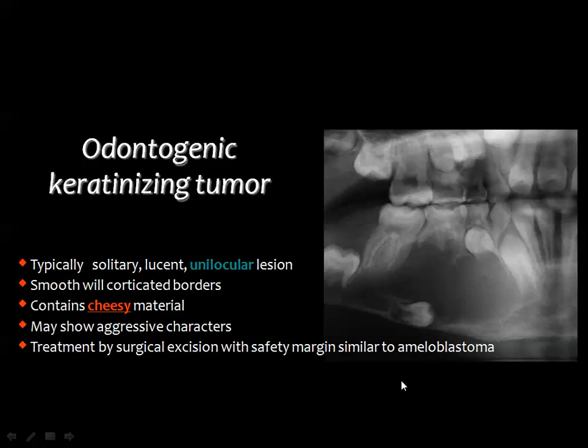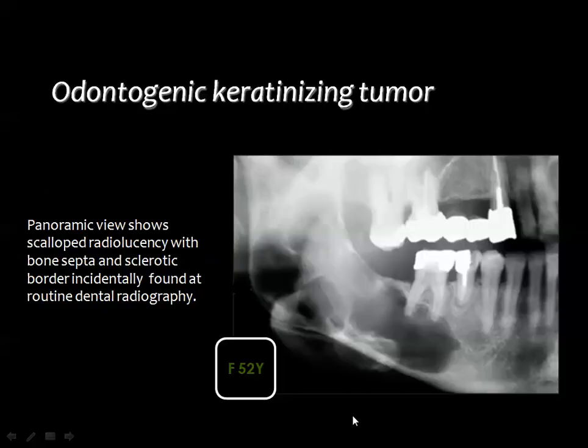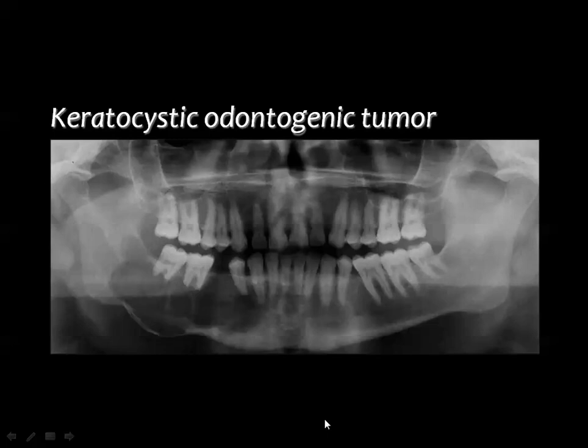One of the helpful diagnostic criteria for odontogenic keratocyst is the unilocularity, the intact appearance of the roots of the teeth related to the tumor, and also the multiplicity. This is one of the signs that favor the diagnosis of odontogenic keratocyst.